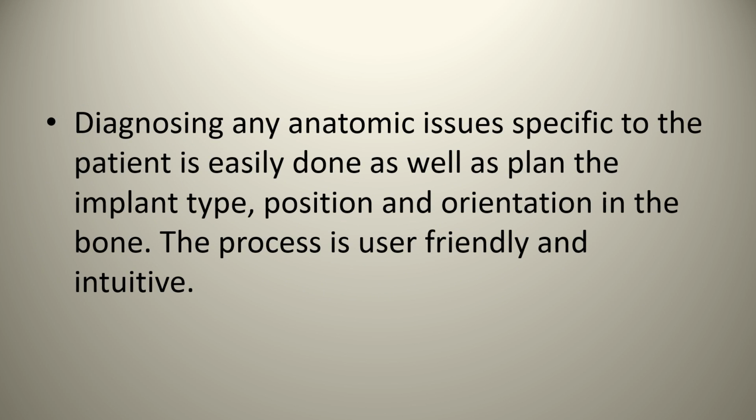So you also have the ability to diagnose any anatomical situation specific to the patient, and this can be easily done, as well as plan for the type of implant, the position and orientation in the bone, and the process is fairly user-friendly and intuitive.